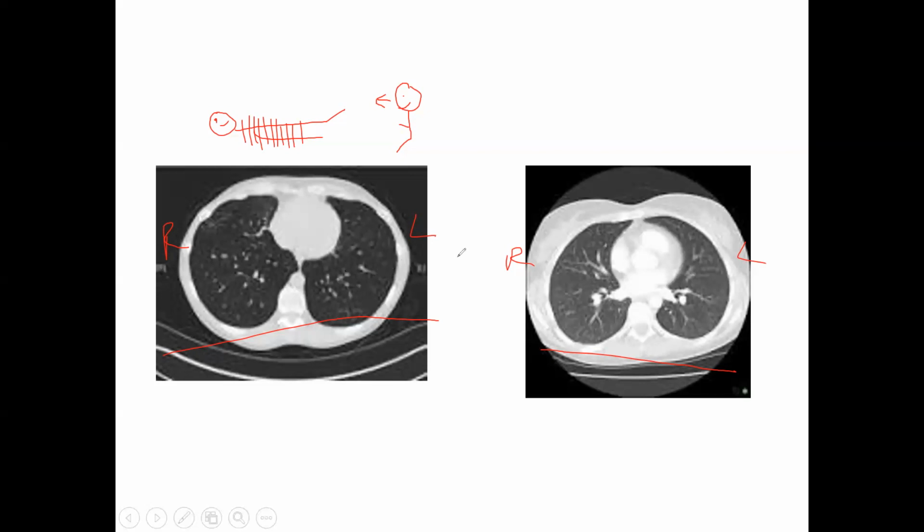So both of these people present with relatively healthy looking lung fields, but I'd like you to notice when we're talking about lung compliance and stuff to that effect. And remember, compliance is the ability of the lungs to receive volume. You can tell based upon the difference in radiolucency and radiopaqueness that the patient on the right-hand side of your screen versus the patient on the left-hand side has more adipose tissue. So you would have more pressure on the chest, so you would have a decrease in chest wall compliance over here because the extra weight of this adipose tissue is going to kind of hold that down.